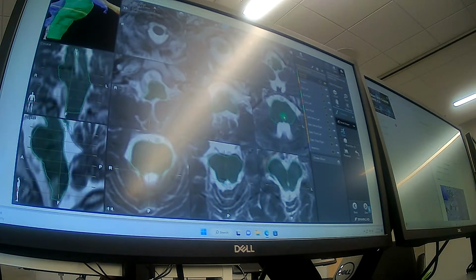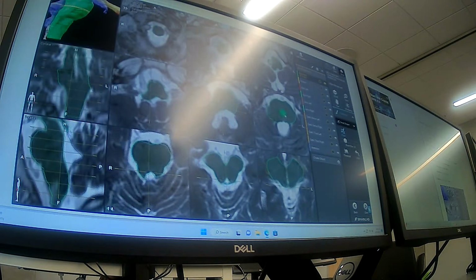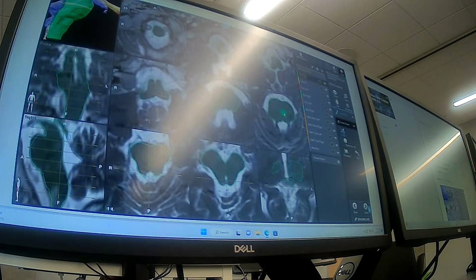Figure out you're on the brain, you're not down in the pelvis somewhere, making sure there's not something questionable going on.